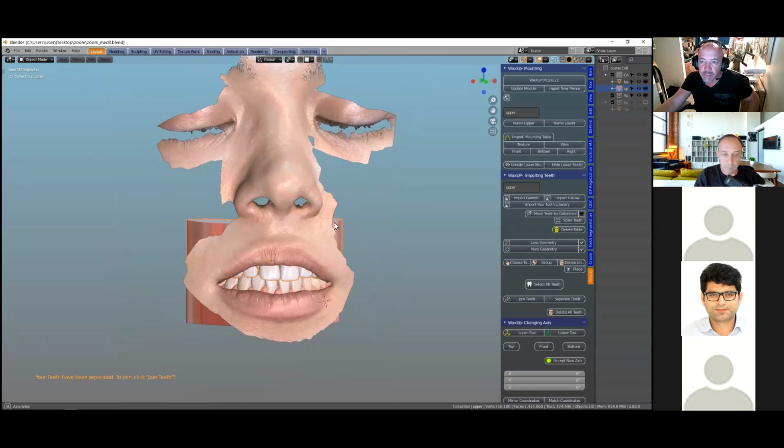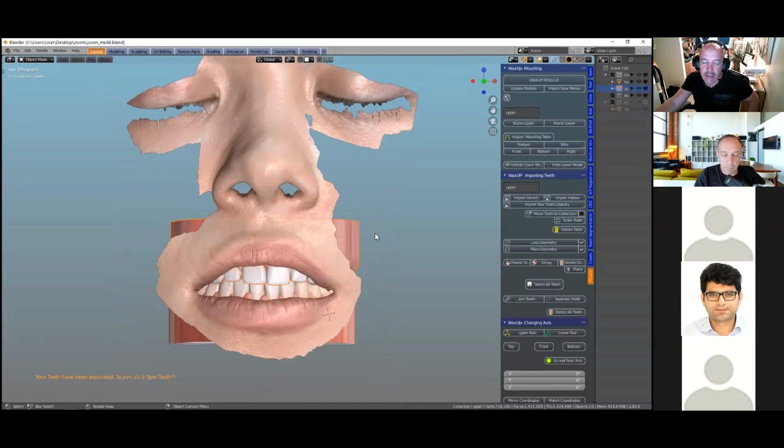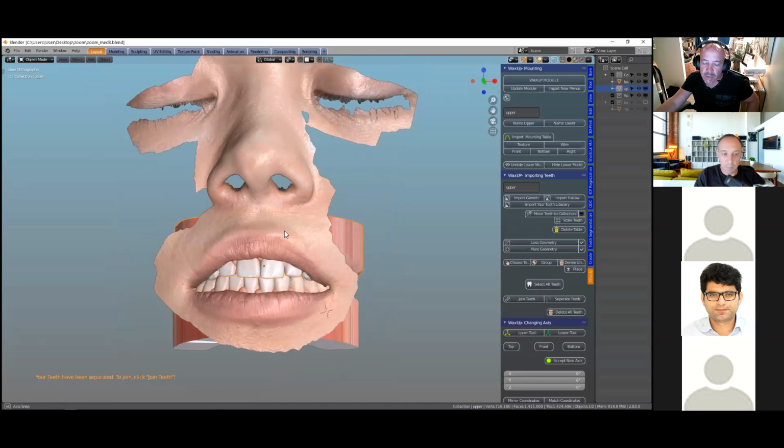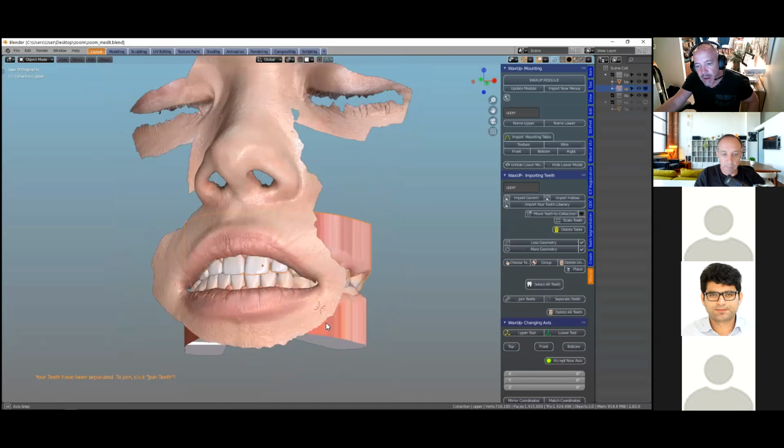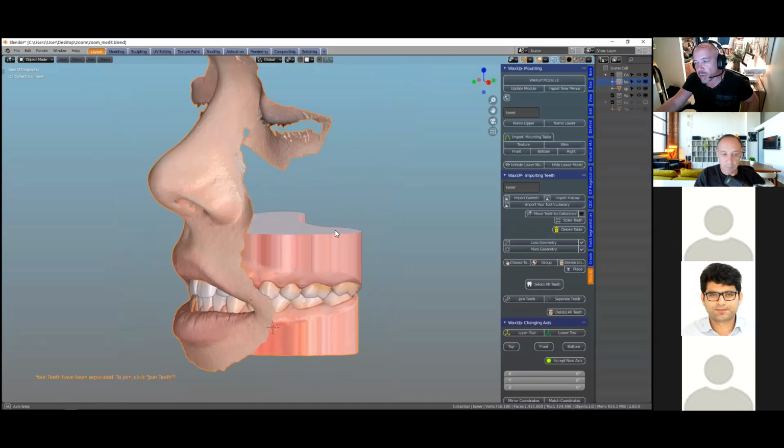Now, here this person, say for example, wants to have a few front teeth. I've actually aligned this with the model designer, and this is 2.9. Oh gosh, I need to install that quickly, but now I've got the WaxUp.